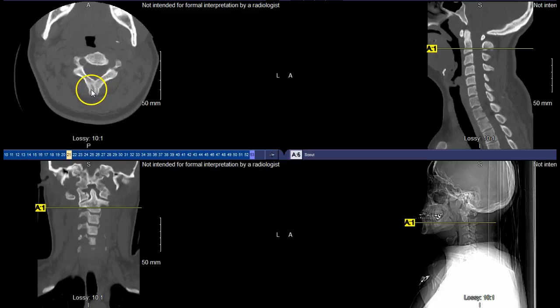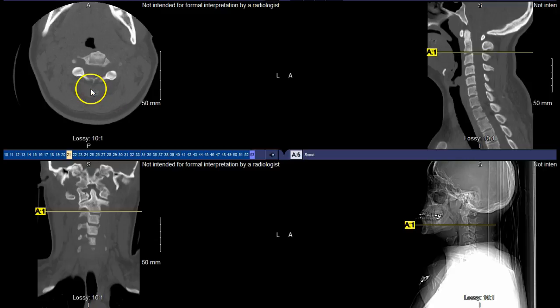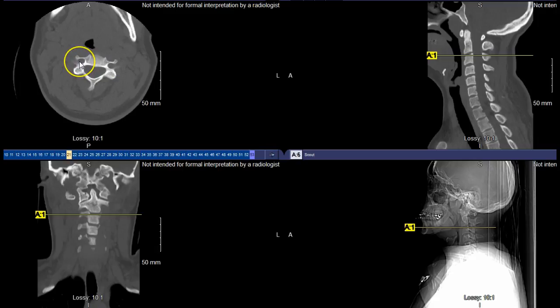So speaking of that, you can see those bifid spinous processes here. You can see those little tips. So just kind of look for the bifid spinous process, look for the transverse foramina, and that will kind of outline, hey, these are the key structures. So really a great image right there of the transverse foramina. You can see that the vertebral arteries would pass through those transverse foramina, while the spinal cord would be a part of that vertebral foramina.